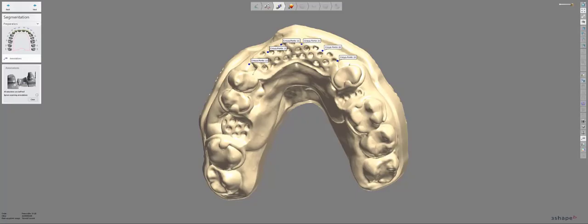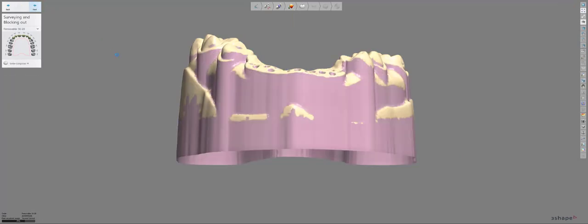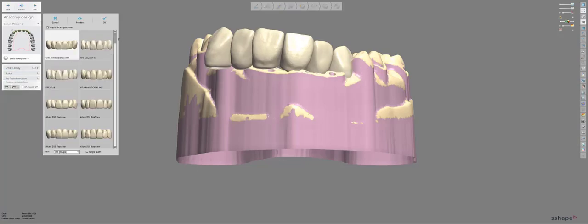I've created a partial work order which has anterior and posterior teeth missing, but I've only selected the anterior teeth just so we are not bombarded with posterior teeth when looking for our newly added Vivident DCL SPE A26 A7 and 5 library. Lucky for me, I don't have to scroll very far as it's just right there.